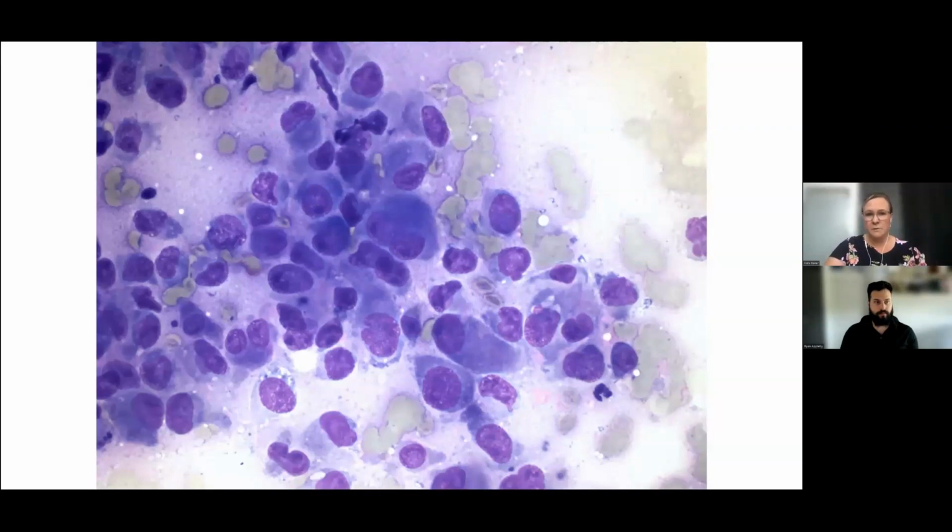So we've got multiple criteria of malignancy here. We like to see at least 3 when we're trying to decide if we're dealing with a malignant population, and we certainly have at least 3 in this population. So this is consistent with a sarcoma. And so then we have to say, is there anything that can help us decide if we think it's more likely to be a certain type of sarcoma versus another type?